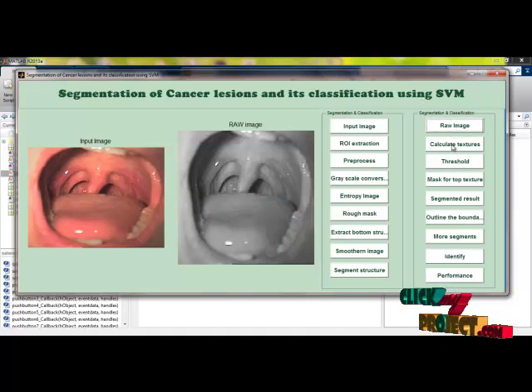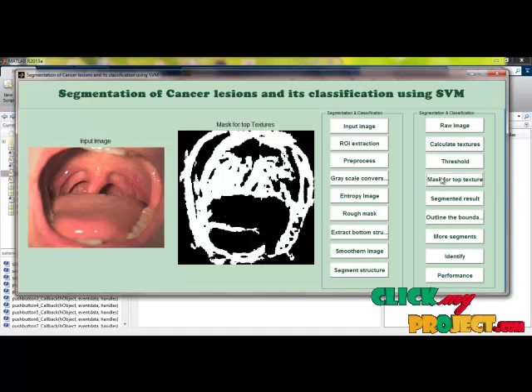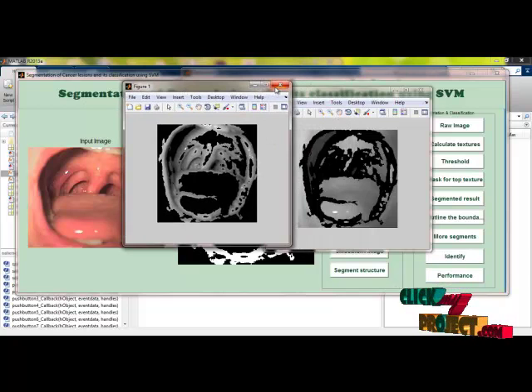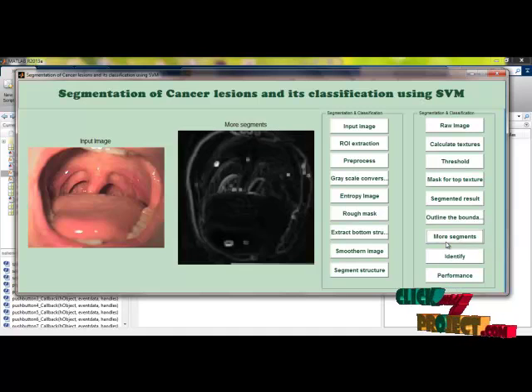Again we do the same process for the background. In every process you can see the grouping is enlarged, that means it is covering the region. These are the final segmented regions. Here it didn't get any affected region. Here see the outline boundary regions. These are the two separated objects and background, but here there are no affected regions. So here is an example of segmentation, and the other processes work in the same way.